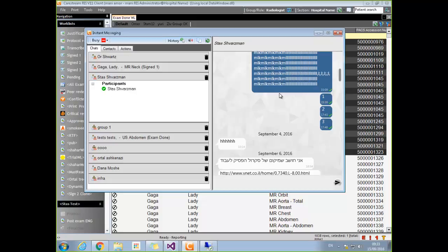We are showing that from our machines on purpose. We ran it from the source code to have the latest version. To set this up, there will probably be some specific ports or other things that need to be documented at some point in time.